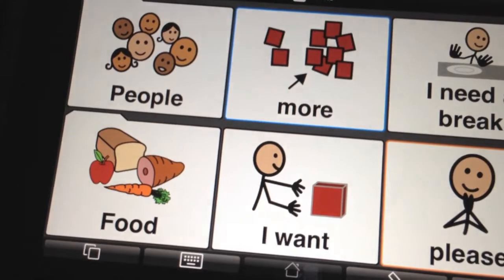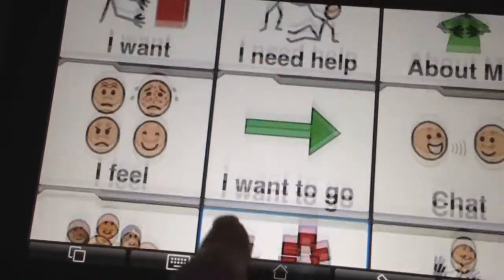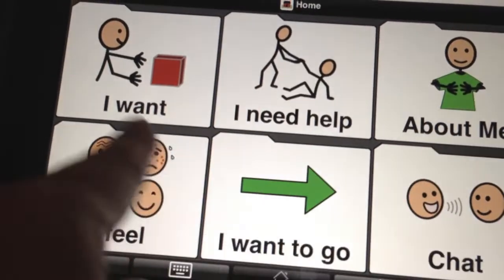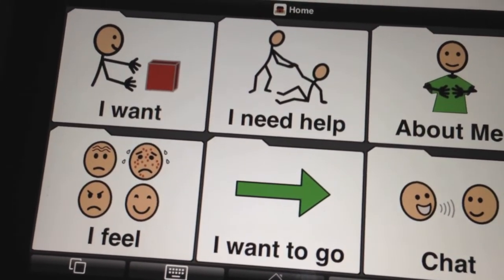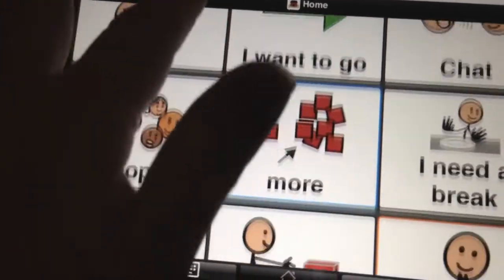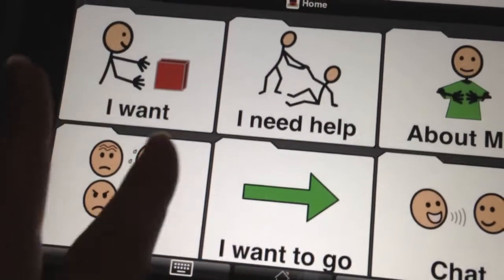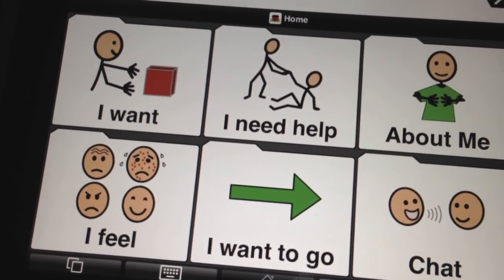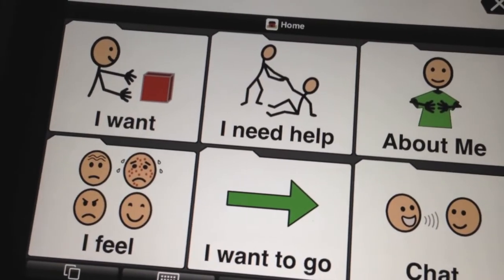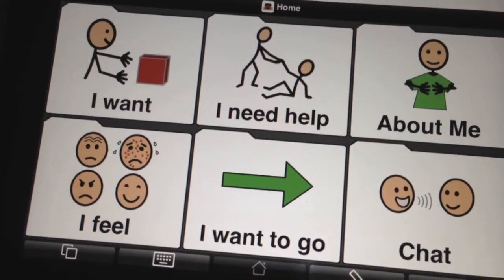And there's more on that page, and I need a break, so those are good ones. So let's say we don't want those at all though. There's a couple different things you can do. You can either move them down to maybe work on them later, or you can put them in that file cabinet in storage in case you think that you want to use them at a later date but you don't want them visible right now, so that you can just pull them out of that filing cabinet again.